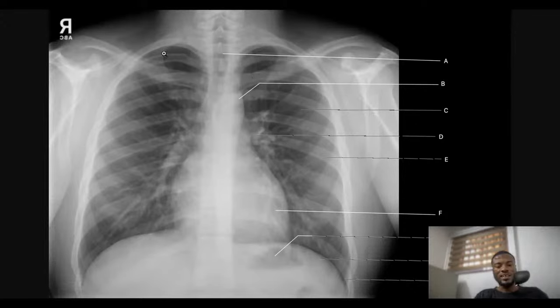We also have the lungs here. This is the right lung. The whole of this place from here down to here, all of this is part of the right lung. I'm coming. Let me see how I can use the paint application.